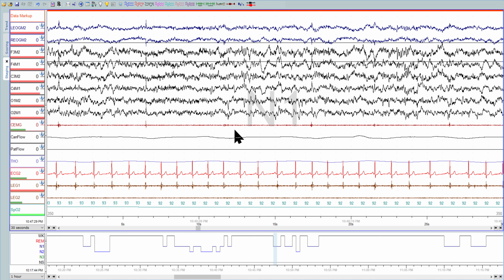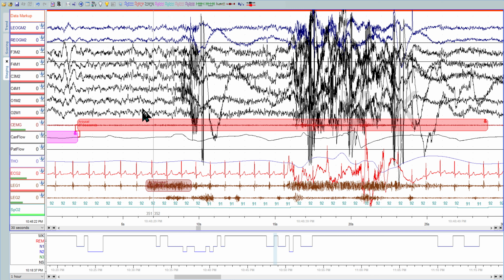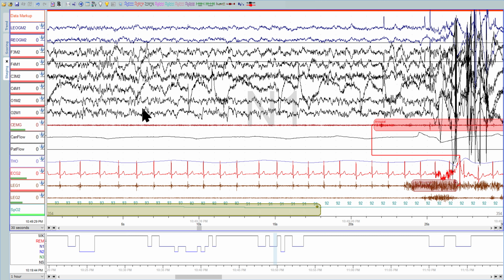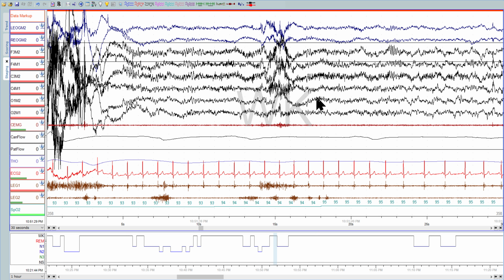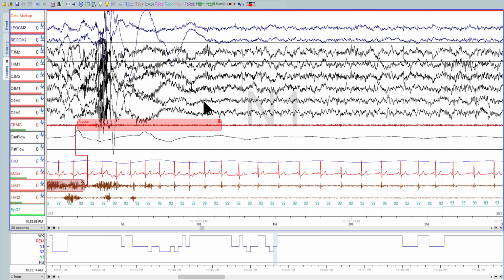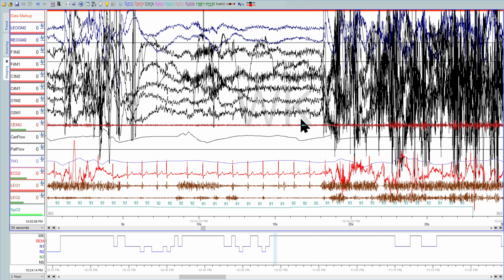You started 1 perfectly there. 1, 1 with an arousal for wake, and then back to 1, and 2, then 1, and then 1, and wake, and wake, and 1, 2, and then with this arousal, I think this stays in 1 like you have it. And wake, good.